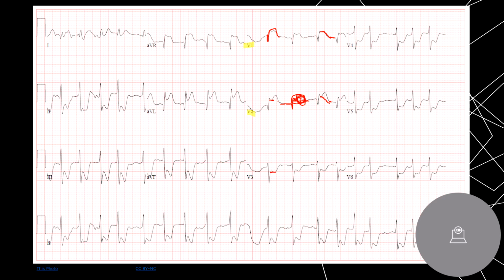Anterior, look, it's depression. Boom. Boom. Baseline, J point. Depression. So you have septal infarction, but not anterior. That's very peculiar. Excuse me. That is very peculiar. Again, you go look at lateral depression, and high lateral though. Look at this. You have elevation. Boom.